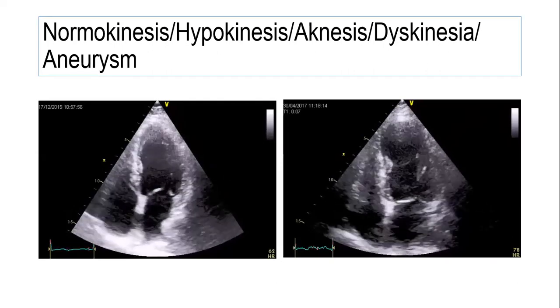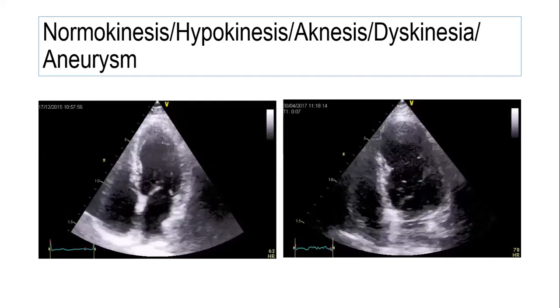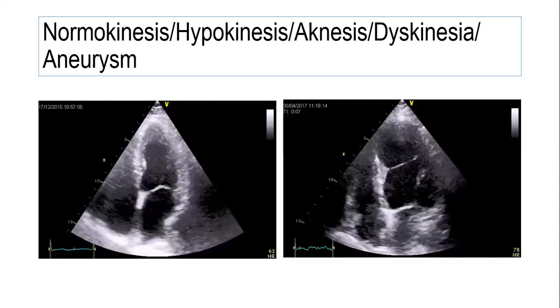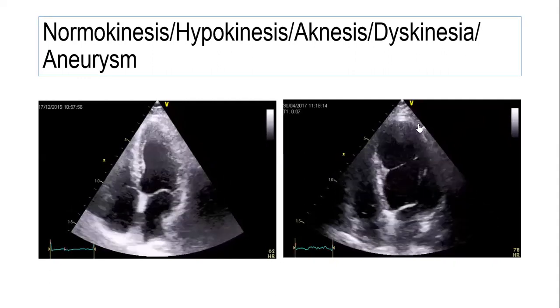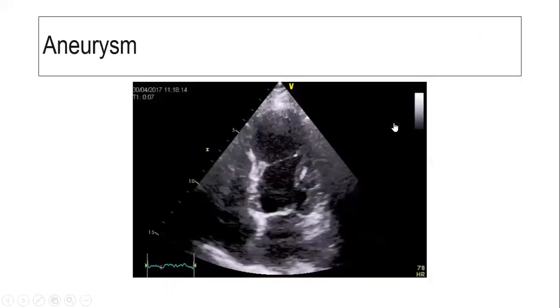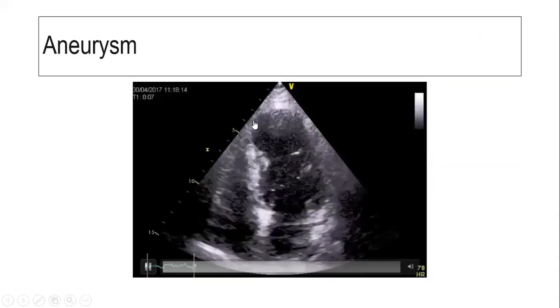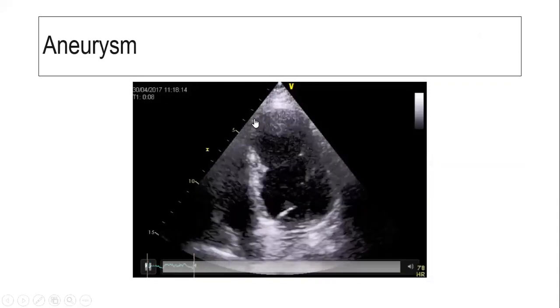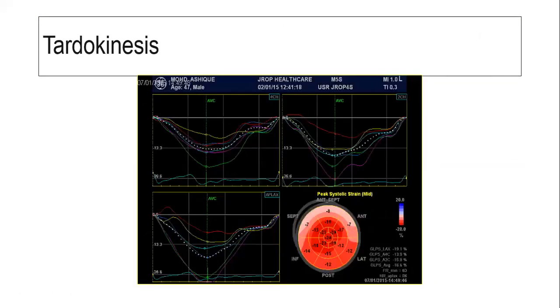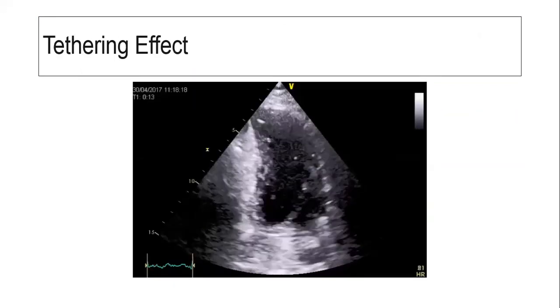At present, I cannot differentiate. Pardon? At present, I am not differentiating this aneurysm. Maybe aneurysmal dilatation. Let me see if some more are there. Now this is the zoomed-up view of the aneurysm. This is all dilated, with persistent dilatation during diastole. This is known as aneurysm. Let me just show more.